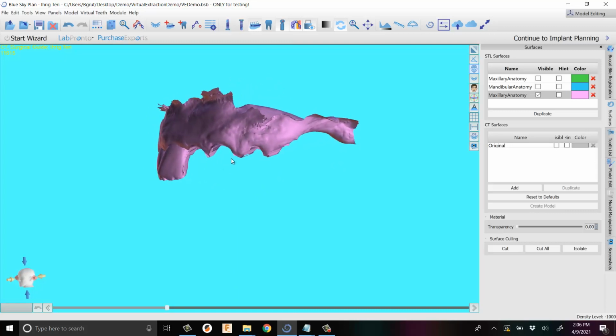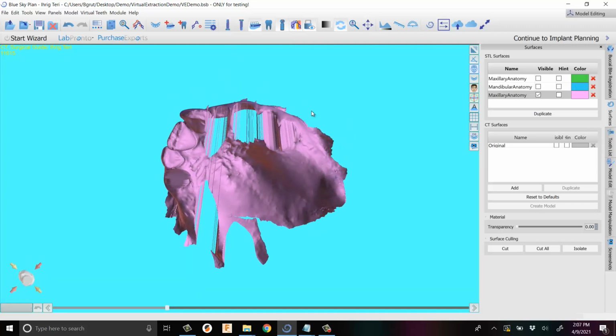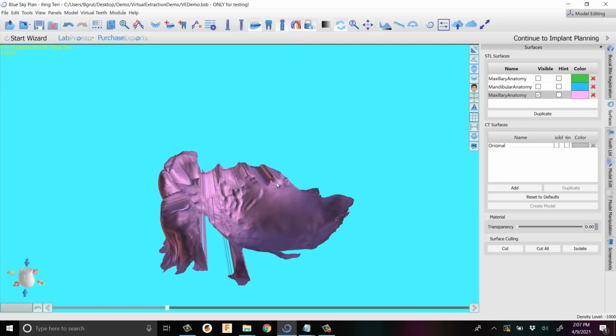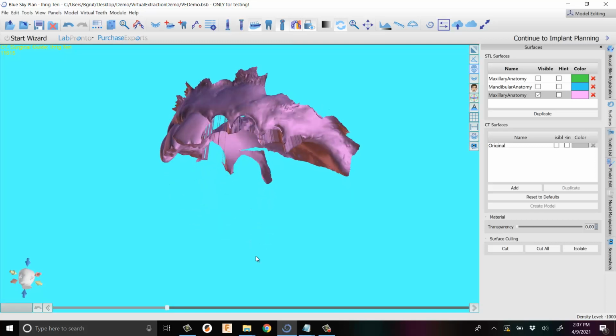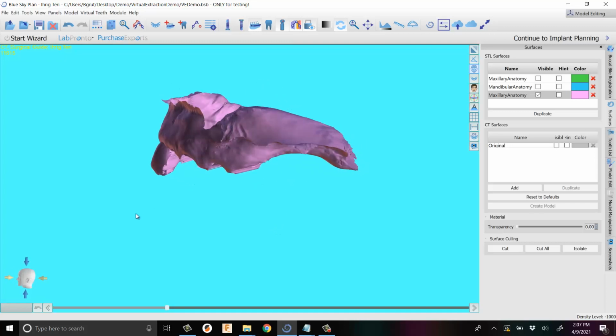Maybe I could have done one fewer tooth. But again, these areas are all screwed up still too. The only one that's halfway decent is this one, but look where it came out above the gingiva. I had to cut it again. So as you can see, cutting a lot of teeth just does not work very well. There are ways to do it, but they're a pain.